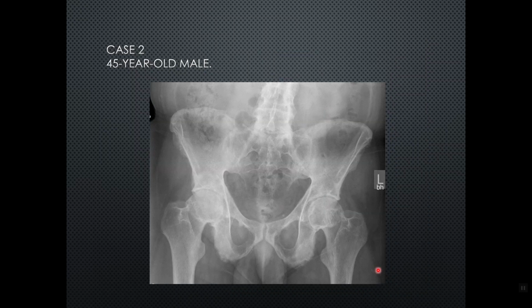In this case, you can see multiple changes in this AP pelvis. You can see all this whiskering or proliferation, that indistinctness and fuzziness at the insertions of connective tissue, muscles, etc., on the pelvic side. You can also see changes in the sacroiliac joints, so they're not clearly demonstrated. In other words, perhaps some kind of ankylosis or fusion of the SI joints is also seen.